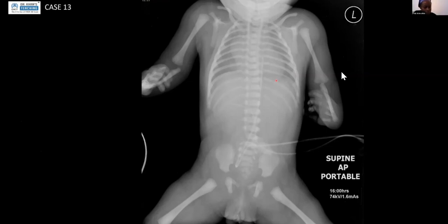I see it directed to the right hepatic vein, could be in the right portal vein branch. Okay, that's correct. Okay, sorry, carry on assessing the radiograph.